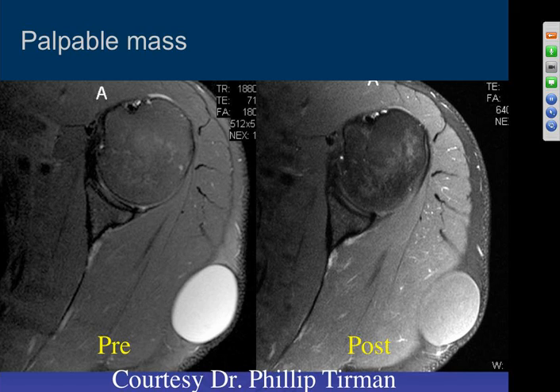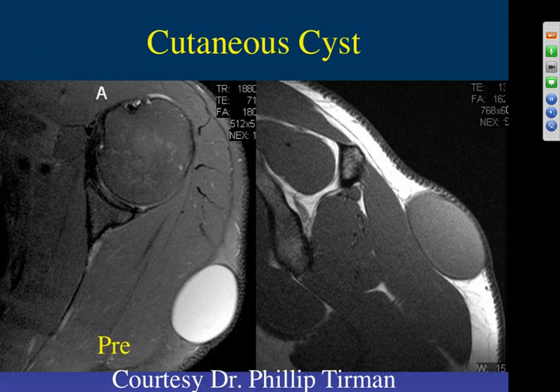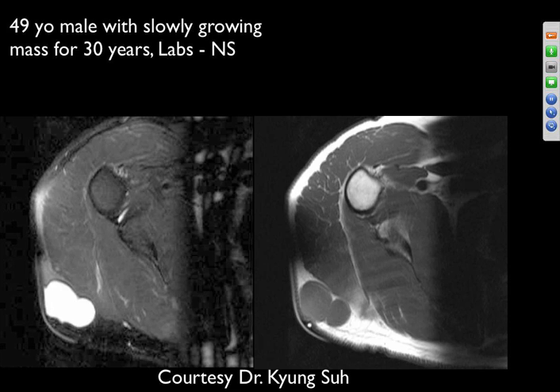All right, there are pre- and post-contrast images of the shoulder. They show a mass which doesn't have any obvious enhancement. Well circumscribed, it has a component which is mostly within the subcutaneous fat, so probably a sebaceous cyst or epidermoid. Yeah, they just call it a cutaneous cyst.